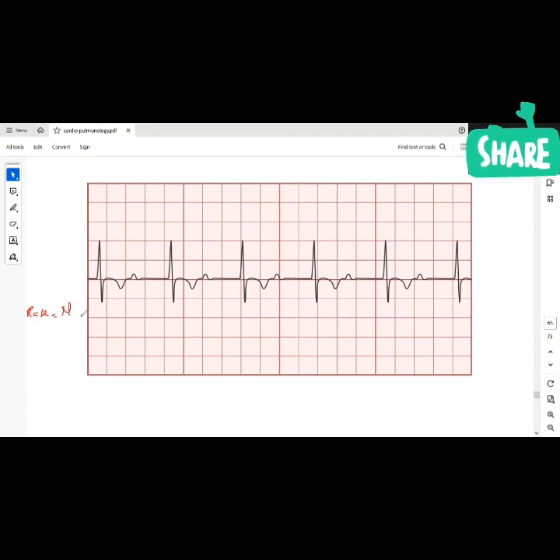Good. Okay, what do you check next? Rhythm. Tell me about the rhythm. Rhythm is constant. What's the proper term? Rhythm is regular. Equidistant is regular. Good. And then what else am I checking for in rhythm?